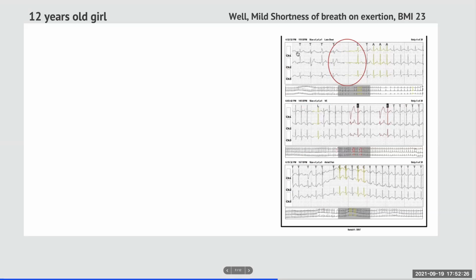Look at this, what's happened here. So you have two P waves which are very close to each other, almost around 300 beats a minute. And then you had a little pause. And in this Holter, this little pause tells you, oh, this lady has got an atrial tachycardia.